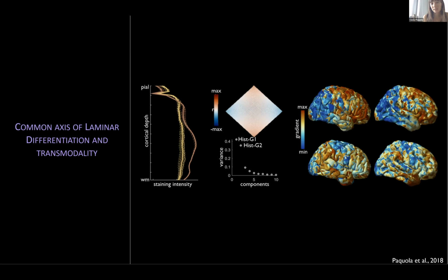Let's look at a few little areas here. In this temporoparietal junction area, you have a red part on the BigBrain, and it really just jumps over to your fsaverage quite nicely. So we can inspect this to see that we have a good alignment of the patterns, the colors on different sulci and gyri there. So we can transform this histological gradient to fsaverage5, so into an in vivo space. And then we can compare this to other forms of in vivo imaging.